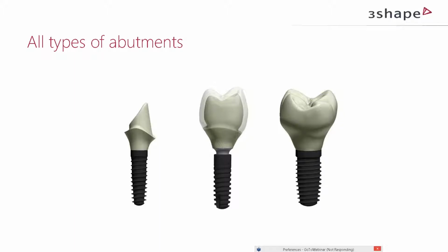Since we already designed the customized abutment, we have information from the emergence profile that should help us, even sometime in the future, design a very good, correct, and exactly the same fitting customized abutment.